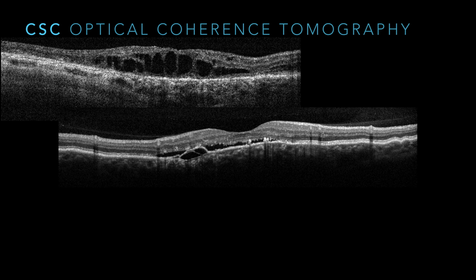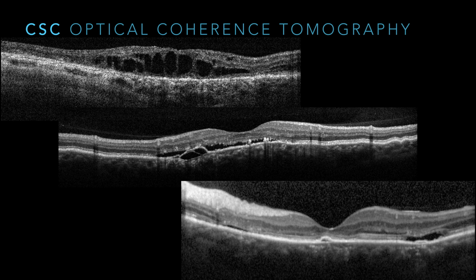Here's some more subretinal fluid, PED with this little tiny hyperreflective line within the PED that may represent some delamination of Bruch's membrane. And again, notice on the right side of this image there's almost like subretinal fluid, but it might just represent some atrophic photoreceptors that are no longer making outer segments because the interdigitation zone's gone.